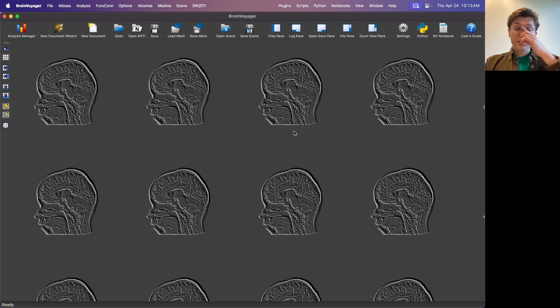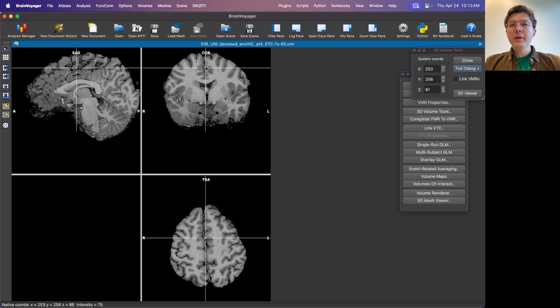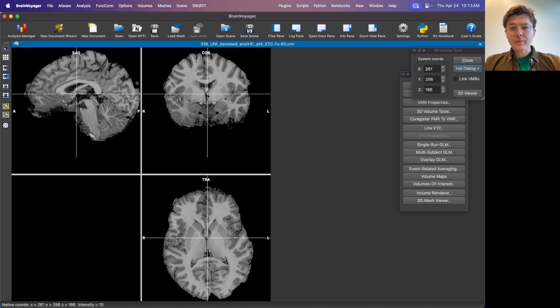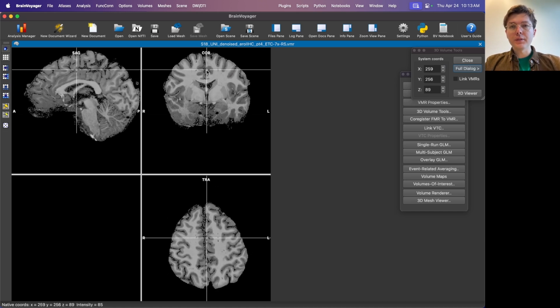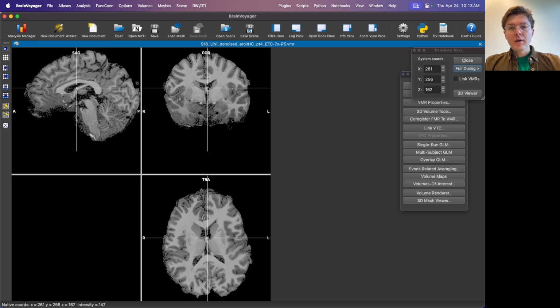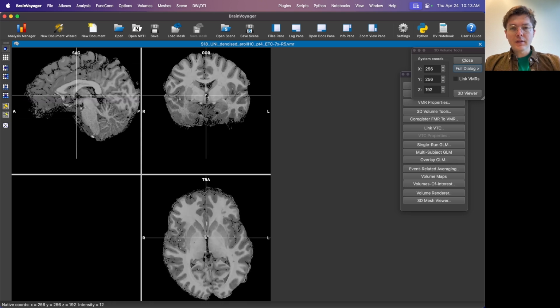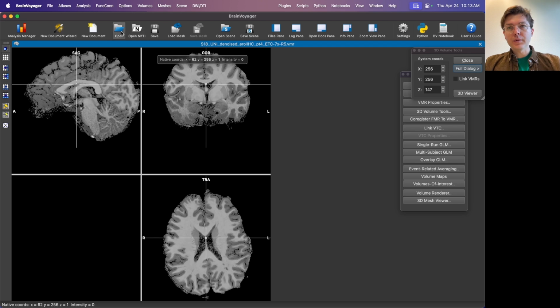So in the context of this video, I have three files to think about. First is a pre-processed anatomical image. I'm not going to talk about how this image can be processed better or in different ways. I just roll with whatever we have right now. So this is the brain extracted, and some filtered anatomical image.